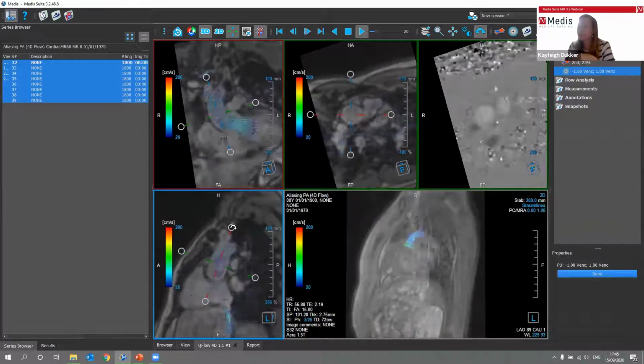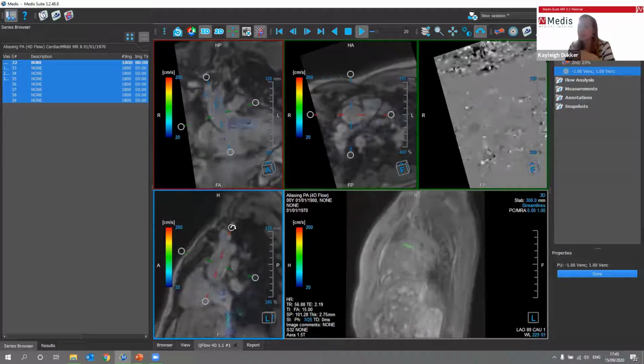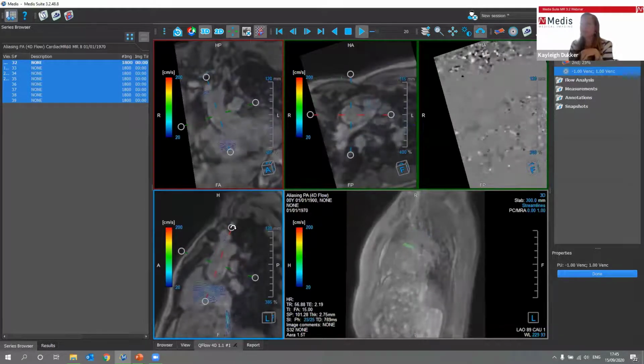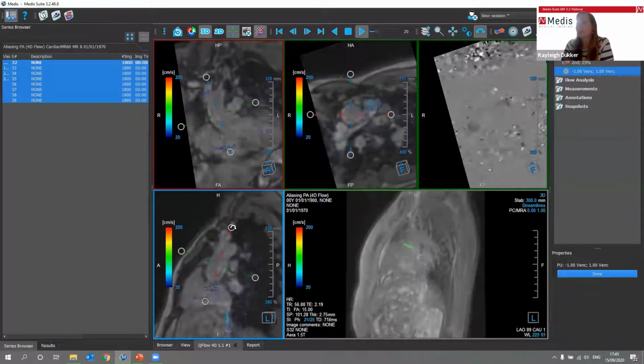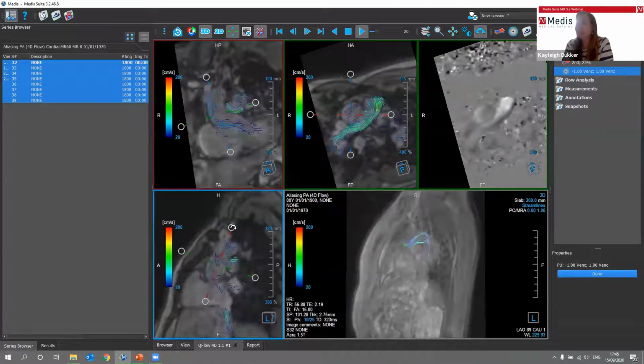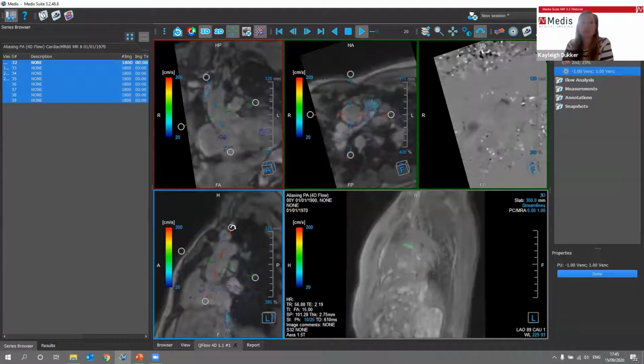So for Philips data sets, it's not necessary, but for Siemens, it's advised, for example, and for GE as well. For 2D, they sometimes scan also with phantoms instead of doing a background correction, or using that as a background correction mechanism, I should say, actually. So yes, it is advised to do it, especially a bit depending on the vendor you have, though.